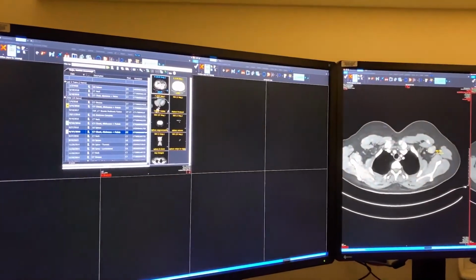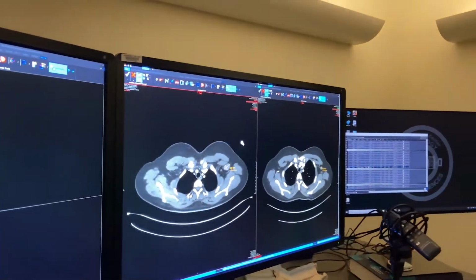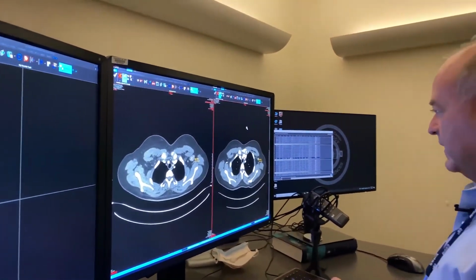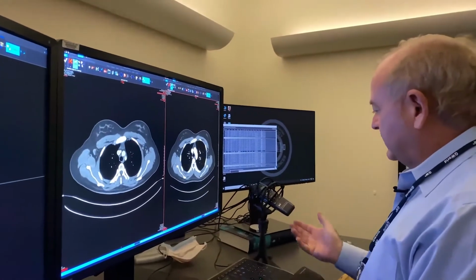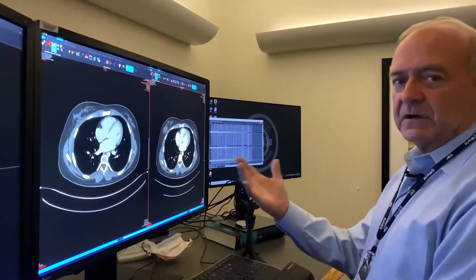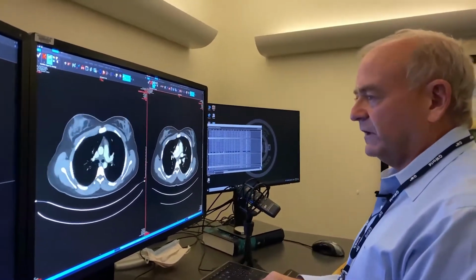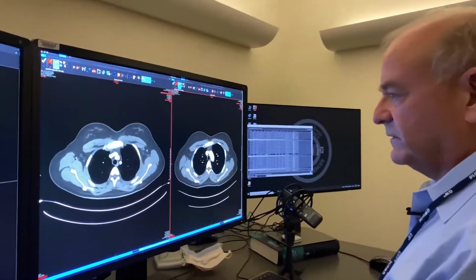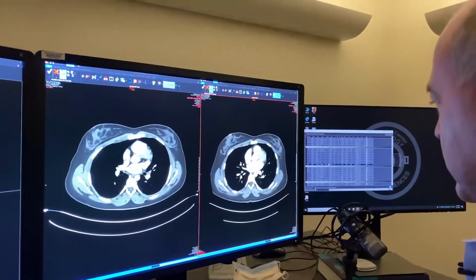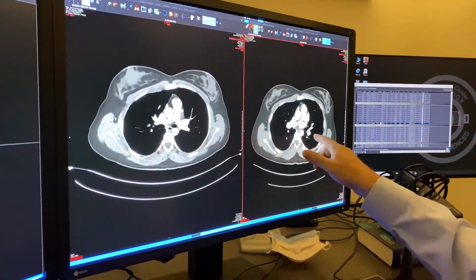That's just what's going on in the background, which most radiologists don't concern themselves with so much, the numerical component of it, rather are just describing in the dictaphone the big picture. The adenopathy has been getting smaller. In this case, the therapy apparently is working as they had planned. So let's go through. You can see more adenopathy here, also smaller. Here in the hilar area, this nodule is a little bit smaller here.